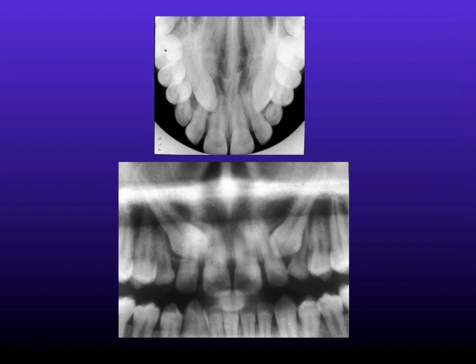One very common combination of images that dentists use is to do parallax between a panoramic radiograph and an anterior oblique occlusal, as shown here, where there are two unerupted maxillary canines. With a panoramic radiograph, we tend to assume a horizontal beam angulation from behind, so think of it as just a straight tube. The occlusal radiograph is taken with a 60-degree, 65-degree downward beam angulation. So we've got quite a lot of tube shift, perspective shift between the two images.